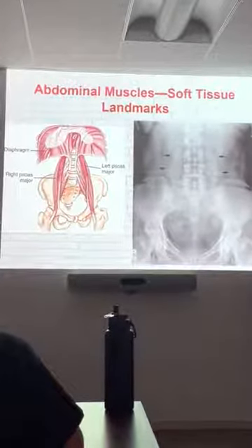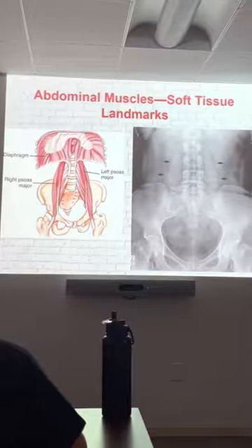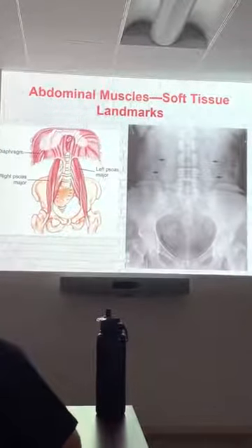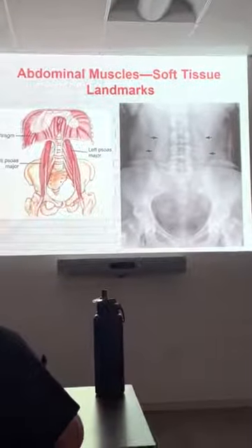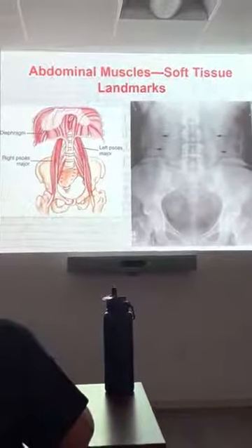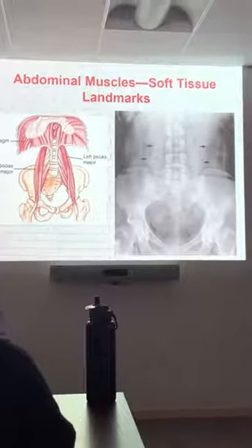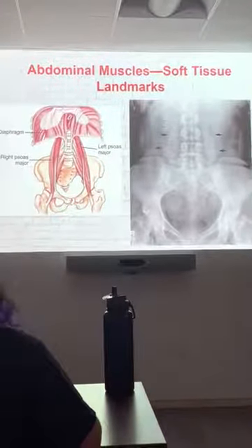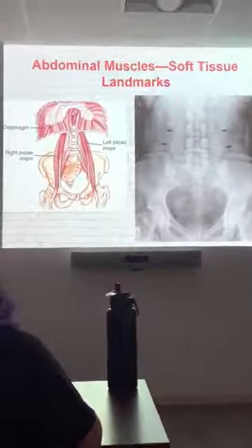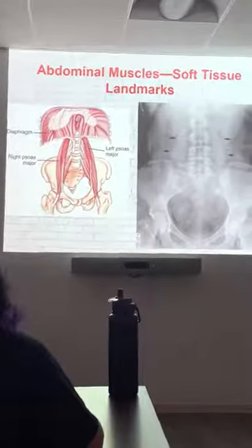Does anybody know the name of those two holes there, by the way? Because those are important too. See little holes right there? You're close. Obturator foramina. Obturator foramina. I always say, imagine the pelvis kind of like a mask. Put it over your head. Those are little eye holes down there. Kind of like a Mardi Gras mask. You don't see it? Now you'll never unsee it, right?